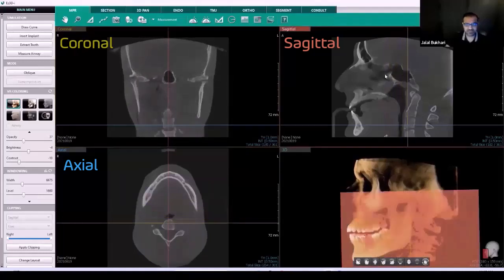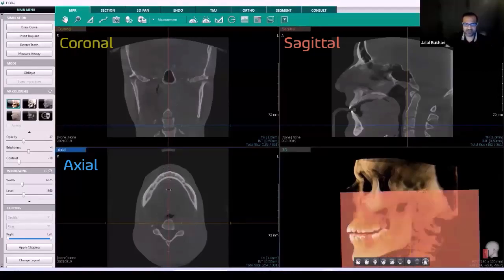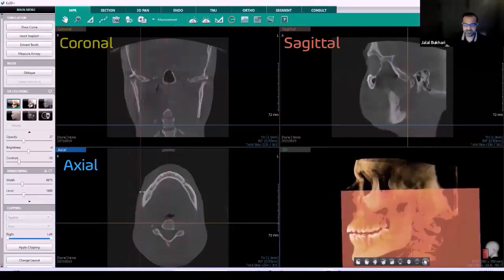And the last section that we have on the CBCT is the sagittal section. So this, again, is actually not great in evaluating symmetry, as I mentioned before. In that case, you can start from the right side or the left side and go vice versa. So we're going to move to the red indicator line here, move to one side, and then scroll through the sagittal section.